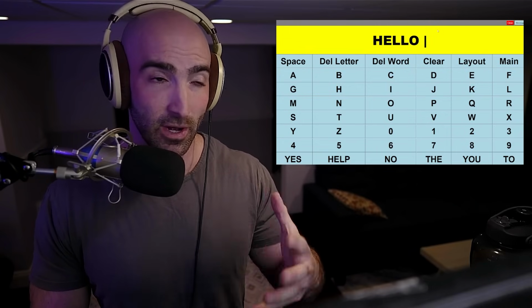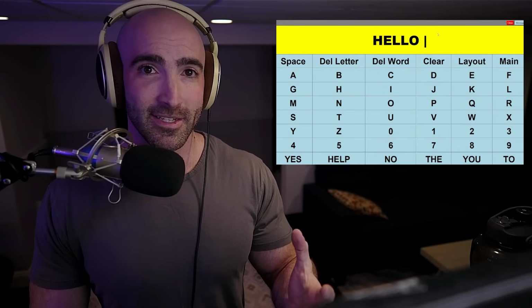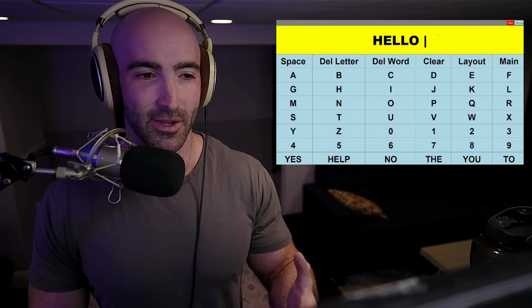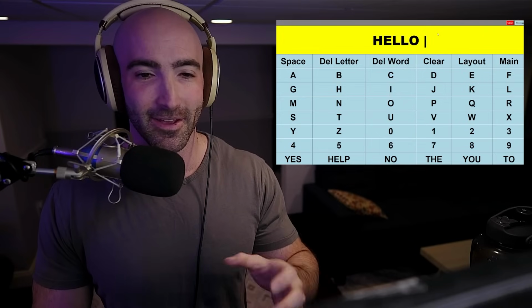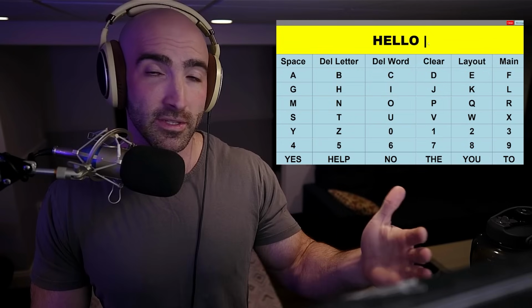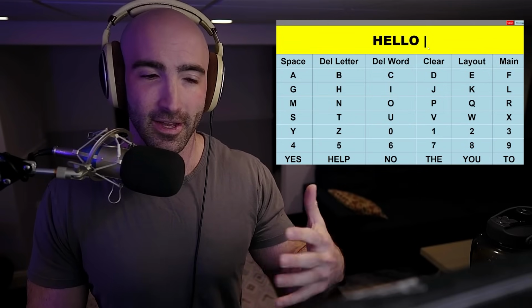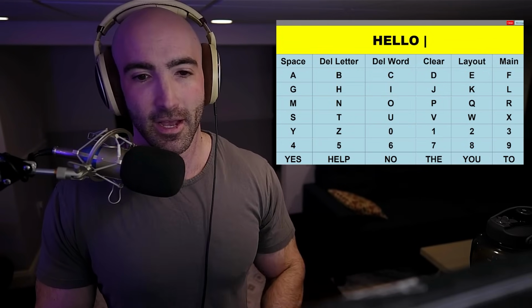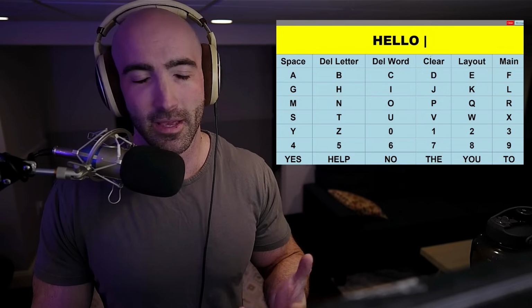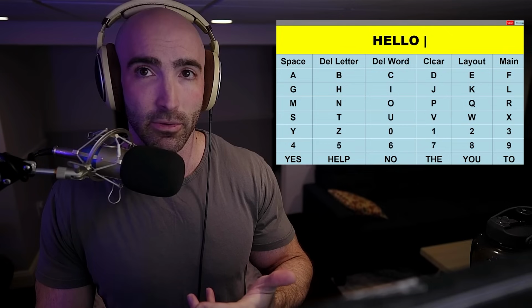I actually had to create it myself using common phrases from movie scripts. So I'll get into that a little later, but very proud of that because it'll actually predict multiple words in a sentence. So it'll kind of do sentence structure or predictive sentences up to 3 words. So it's pretty sweet. And also it will save anything that he said previously.